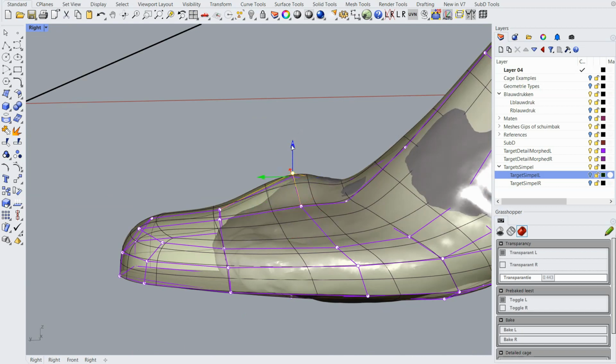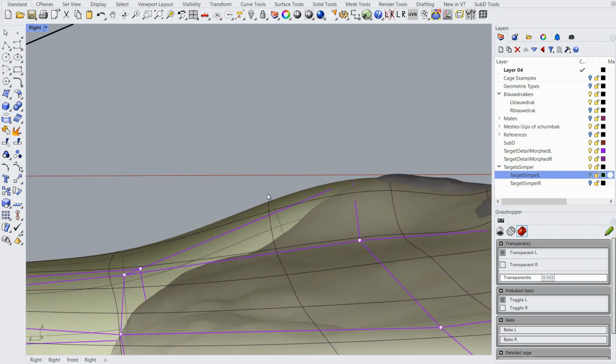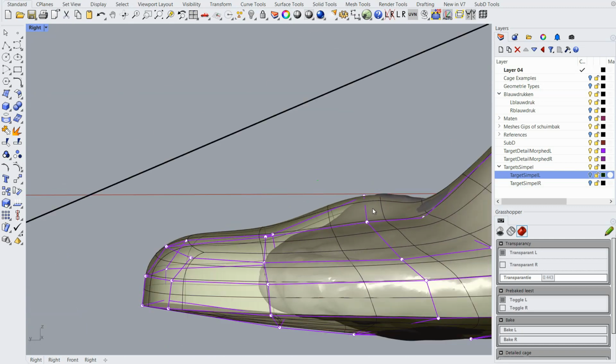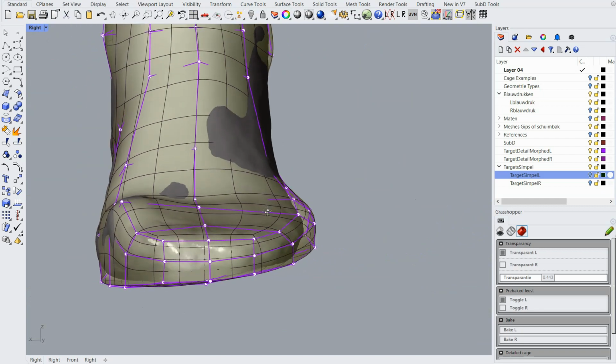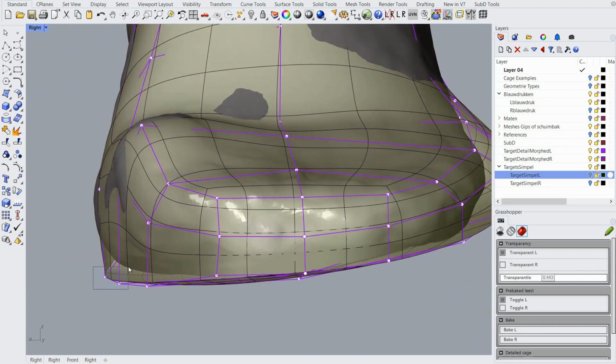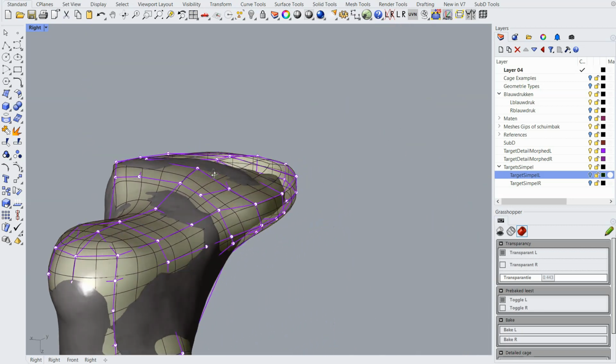And maybe I even want a more detailed modification here, and I don't have a control point over here, but I can do that later on with the final last. It's a bit too much here. Well, this really comes close.